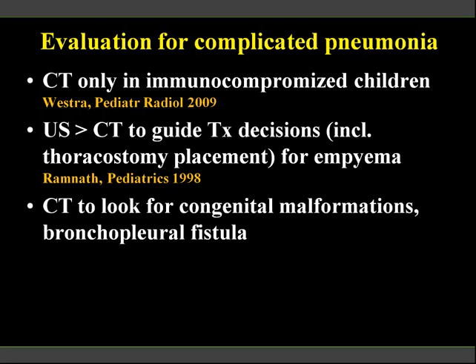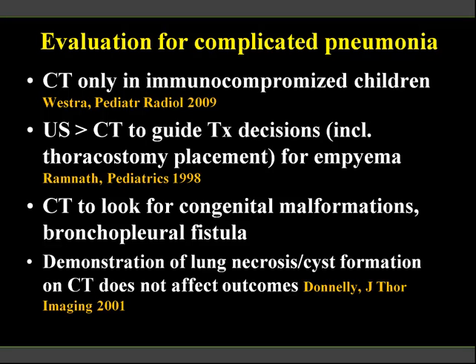CT is used to look for congenital malformations, as I mentioned, and also complications such as bronchopleural fistulas. And then the demonstration of lung necrosis and cyst formation on CT does not really affect the outcomes of the patient. So even though the findings are very vividly shown on CT, there is no treatment implication for necrotic pneumonia.